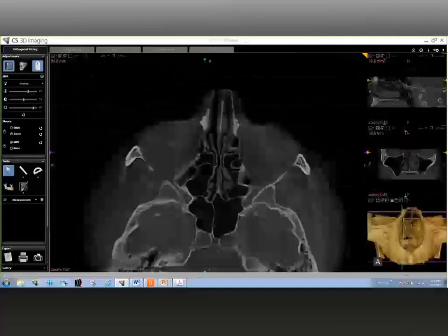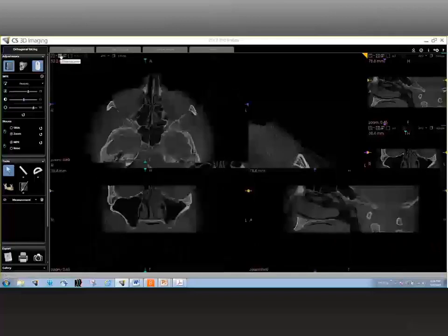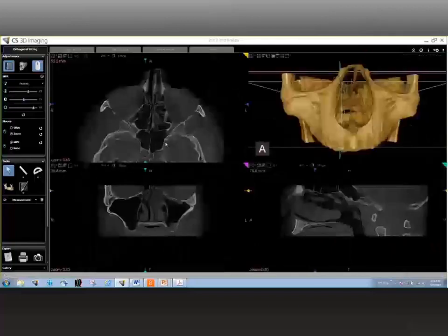And in the axial view, what the arrows point out is those web-shaped structures, which is nothing but the ethmoid sinus, which is another sinus which happens to be a little bit posterior and superior to the maxillary. And further posterior, where you can see the two large compartments, that is the sphenoid sinus, which is located in the sphenoid bone. And they all form together the paranasal sinuses.